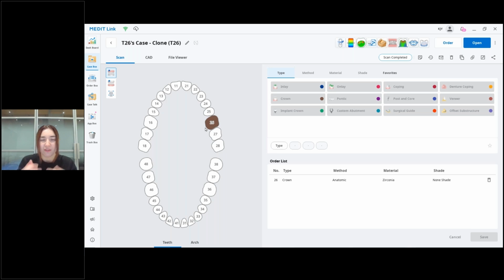If there are several crowns registered, or if there is anything else registered in the form, the program might not be launched. So if you have a case where there are a lot of crowns registered, we recommend you clone the case, create a new form where there's only one crown, the one that you're going to be working on, and then proceed with launching the app.